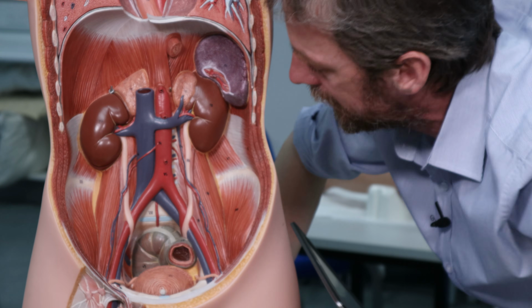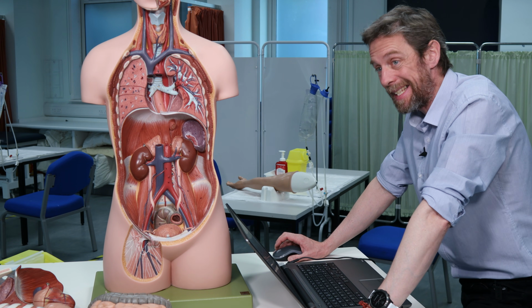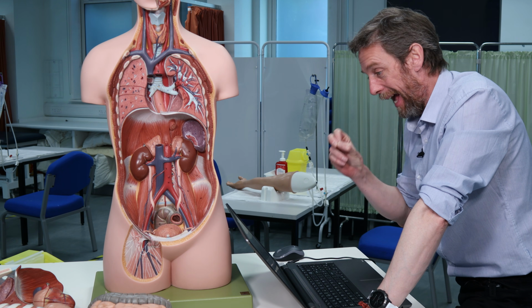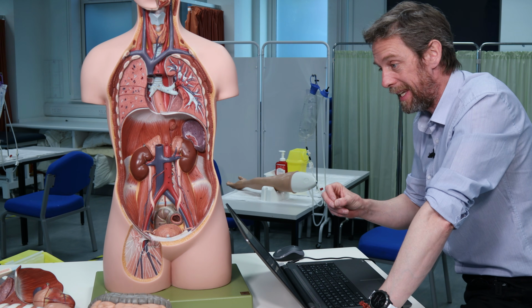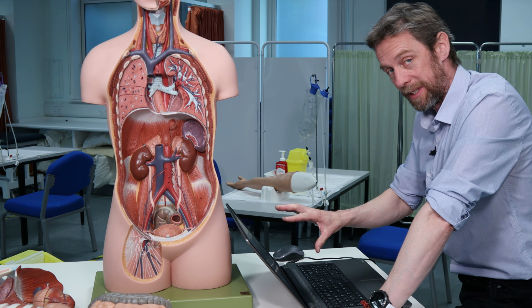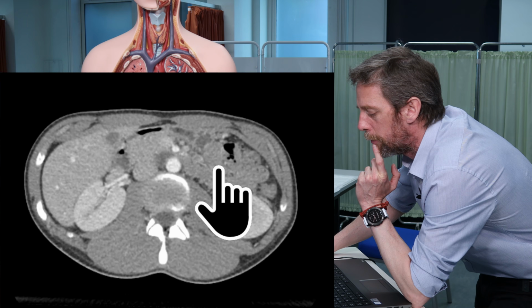So how about we look for the inferior vena cava then? So we have to look out for the portal vein. The inferior vena cava is different to the aorta. Remember that the inferior mesenteric vein, the superior mesenteric vein, and the splenic vein all come together to form the portal vein that runs to the liver. So the blood from the GI tract, the gastrointestinal tract, runs to the liver through those blood vessels, which means that our organisation is going to look different on here, right? Okay, so don't mix up the inferior vena cava with the portal vein.